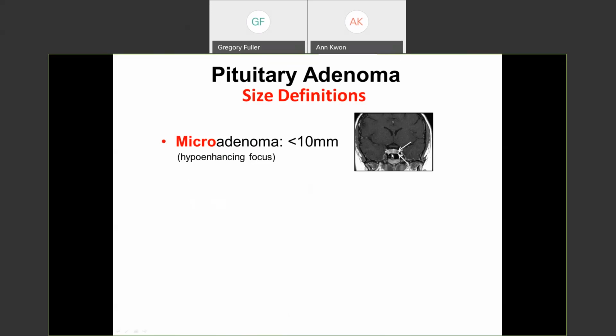So the rest of the pituitary, which of course is outside the blood-brain barrier, enhances avidly. The adenoma oftentimes does not enhance as much as the normal gland. That's because it doesn't have the blood vessels, the acinar architecture. In fact, think about it for a second. One of the ways as pathologists that we diagnose pituitary adenomas, but particularly microadenomas, is effacement of the acinar architecture. That's expansion of a clone which pushes to the side, compresses the blood vessels and all the reticulin that goes with it. So we do a reticulin stain. That adenoma growing as a clone is not going to have the vascularity that the normal adenohypophysis does, and that's why it's hypoenhancing.